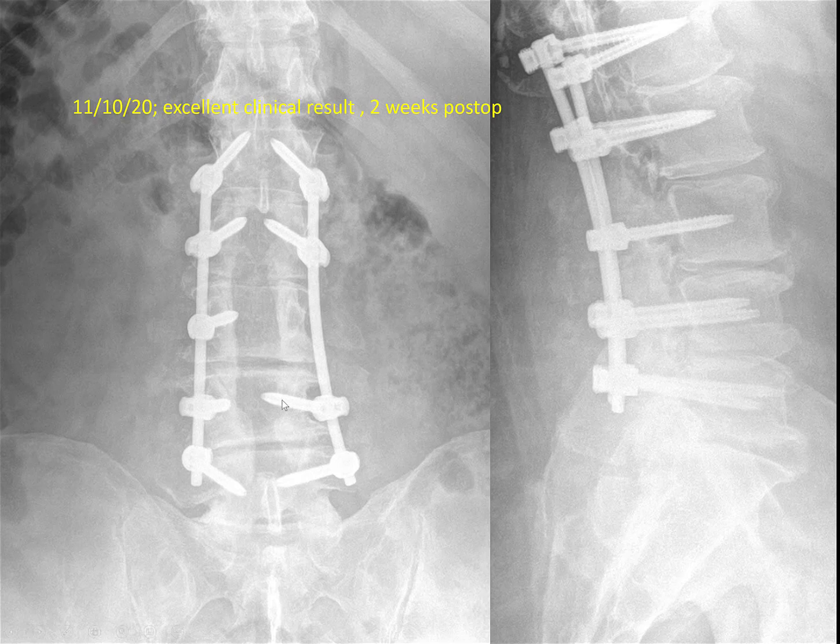This right L3 screw, the initial one, now in these revisions, it's really hard to see any anatomy. All the anatomical landmarks are sort of gone. And the initial screw was medial, and then I palpated it. So I decided just not to put a screw in L3 because I've got plenty of fixation above and below. So the x-rays look great.